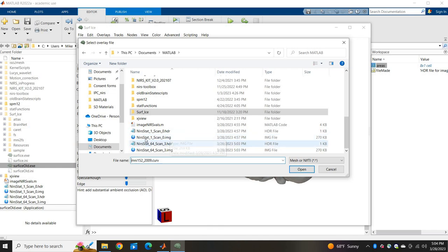And so now, as you can see, it says scan 3. So technically, it's more like the third page. It might not actually be your scan 3, depending on the structure. And whatever 64 is, so row 64, dyad 64, whatever statistic you chose. I'm sure I will improve upon the naming system for this, but it's pretty easy to rename files, so not really a big deal.